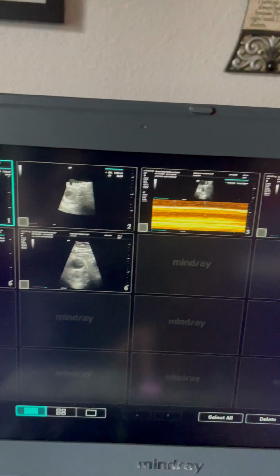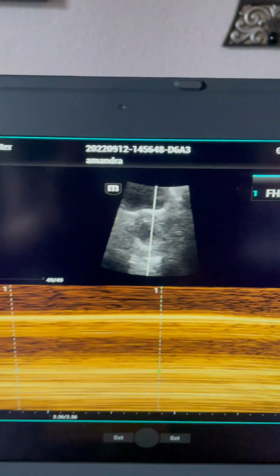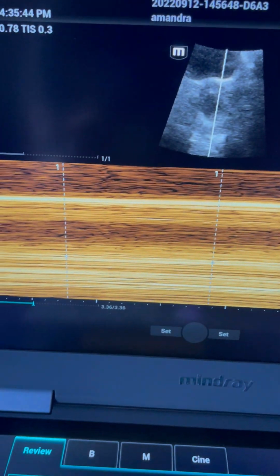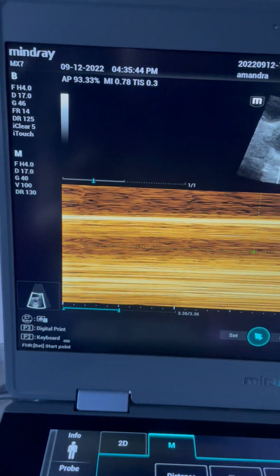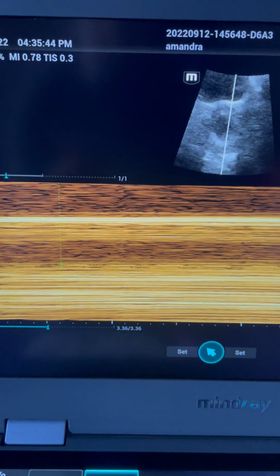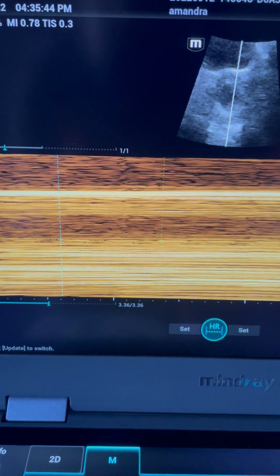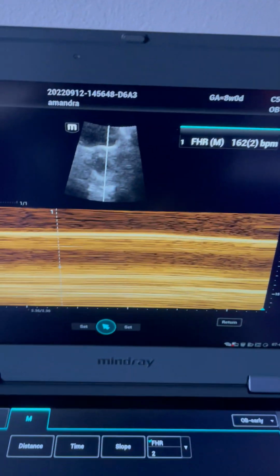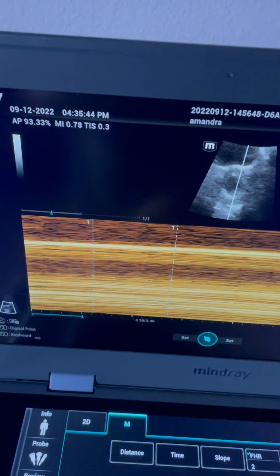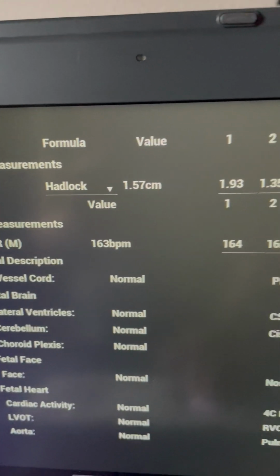Just know that when you go back in, you can change. Like if I come in here, let's do this one. You can see that's M mode. I'm going to double click on it, which is activating it. And now I'm going to go in and measure. Sorry, I'm clearing that off so I can measure again. We can see it. So I'm going to measure it again. I'm going to come in here, and there's 1, there's 2. So I measured it again, and if I go into report, it should now show that I have 2 fetal heart rate measurements.